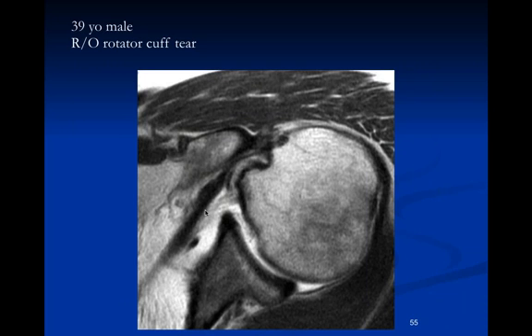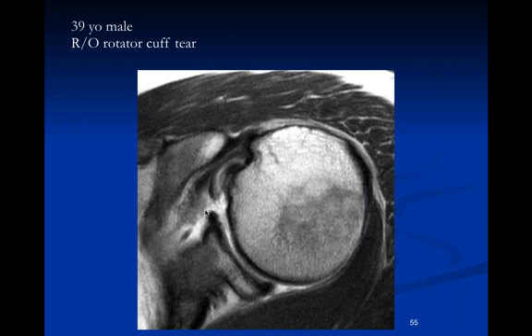Yeah, it's really an extreme internal rotation. Oddly enough, this was the only position the patient was comfortable in where they could do the procedure. Boy, that's interesting. Yeah, you would think this would be a most uncomfortable position. But they would not allow the tech to externally rotate the shoulder for this.